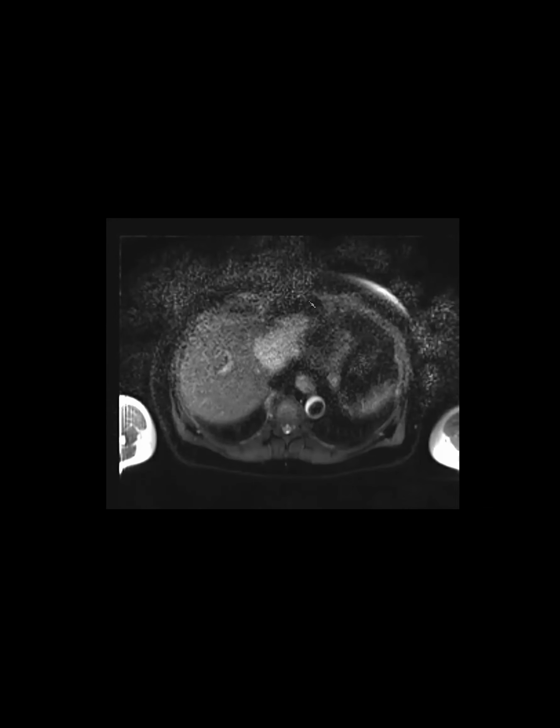So we were thinking, could it be an FNH? The arterial and the venous looked kind of like that, but it's not retaining on the EOVIST. So maybe it's not an FNH. So basically we said this was indeterminate. We can't exclude a malignancy. It doesn't look like anything benign, like a cyst or hemangioma, and needs a biopsy. But there is a clue on this scan.